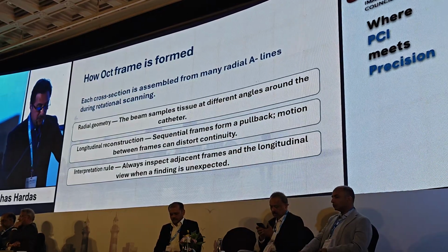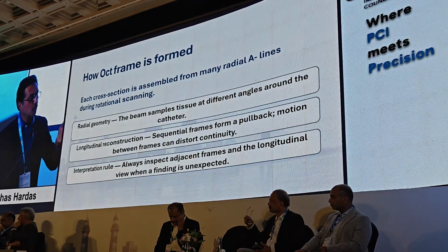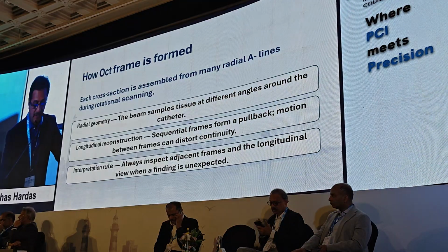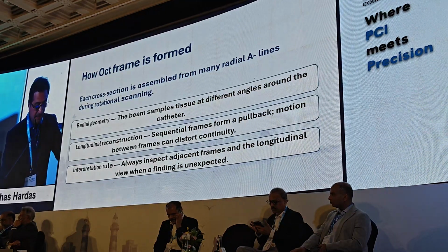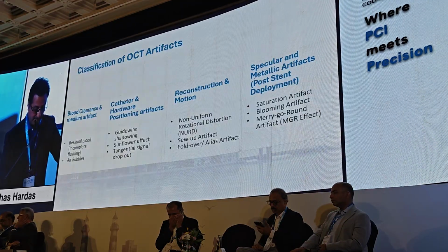Then there is a longitudinal reconstruction, and I think, Ronnie, as you rightly said, that you have to look at multiple frames rather than just look at one frame and comment about the lesion. The interpretation rule is that always inspect adjacent frames.